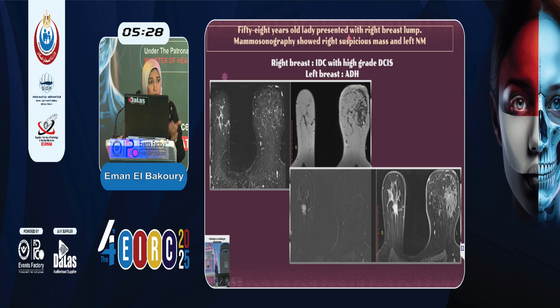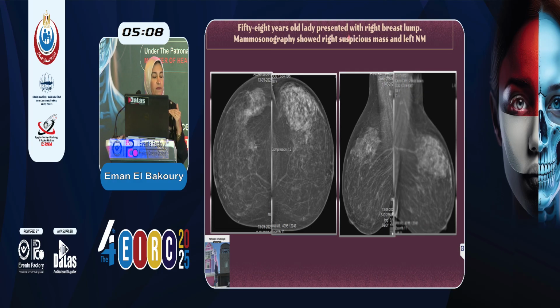So upon reviewing the non-subtracted image, we can see the aggregation that takes an oval or round shape in the MRI. So despite the discordance here between the MRI study, the mammo-ultrasound, and the pathology in another study, we went for another shot of the mammogram because the patient had no mammogram, and here we can see the well-capsulated breast-within-breast appearance of the left breast, rendering this lesion not a non-mass, it's a hamartoma.